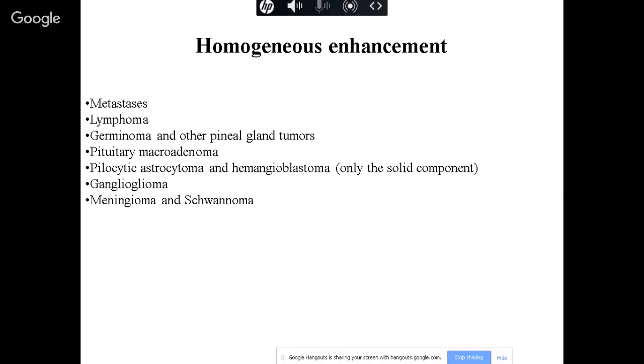Not enhanced. Now, that's the way we diagnose it. Which area in the brain lacks the blood-brain barrier? Yes, one of them, excellent. The pineal gland area sometimes doesn't enhance. So that's where the money is. You give the contrast. Pituitary microadenomas don't enhance, but the pituitary does. That's why you see low signal in the microadenoma, and that's why we incidentally find it. But if the macroadenoma is so big, then they start to enhance. That makes sense? Yeah, I will talk about that.